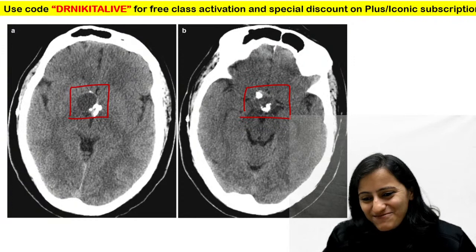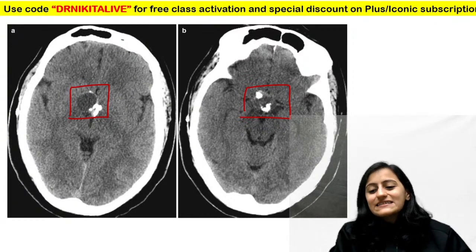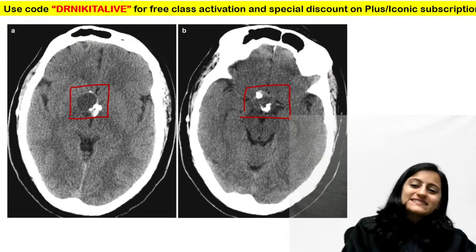Amazing, Prashant. Absolutely right, Prashant. Absolutely right. Yes, AV Sony. This is craniopharyngioma. Yes, Anisha.